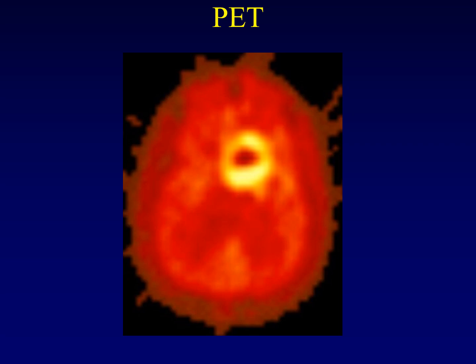There is very poor spatial resolution on a PET image. You can barely make out that this is the shape of a skull in transverse section. You can sort of make out the brain in the middle here, but boy, can you make out the tumor, right? Tumors take up much more glucose. They're very fast growing, and so that's why the tumor shows up well.